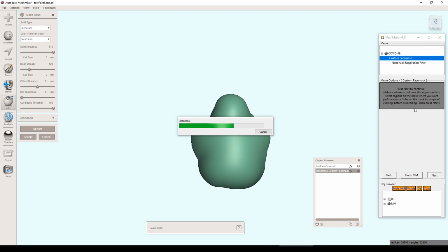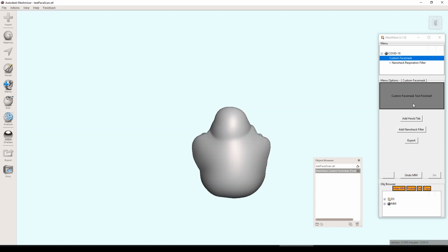As far as this program goes, you don't really need to worry about a lot of the other things that you see on the screen here. Basically what I did was I just took an existing program that I had, stripped everything out of it, and added these two brand new tools in. So I just had a framework that I could use, and it just happens to be what you're looking at right now. But you can kind of ignore all this stuff down here. They do work, but you don't even need to worry about it.